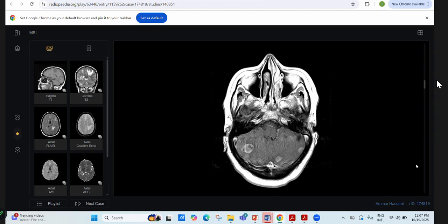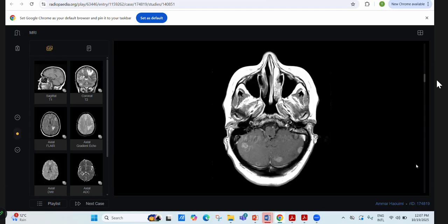Patient has a known case of breast carcinoma. So if the patient is a known case of breast carcinoma, keeping in view the history, these are likely representing supratentorial and infratentorial intraaxial metastatic deposits, with no significant meningeal enhancement, excluding the possibility of meningeal deposits. I would also like to look at the bones of these patients, to know if there are any metastatic deposits.